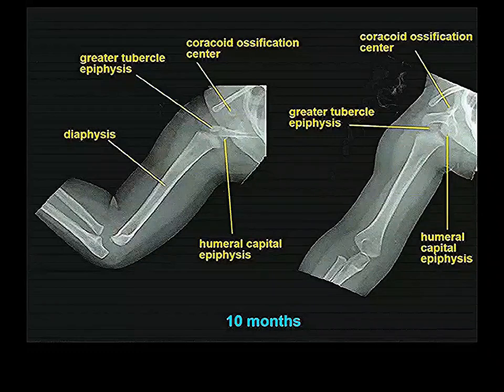You don't have to know the timing of when they develop, I wouldn't think. I don't know the timing of when they develop, and I don't think Dr. Larson does either. So if we don't know it, you don't have to know the timing of when they develop. But you can get an idea from looking at this picture.